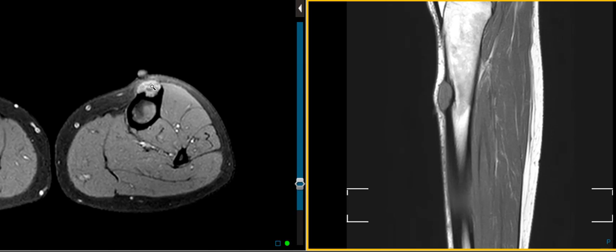And that chondroid matrix, the fact that it's coming off the anterior surface, probably periosteum, the fact that it's been there for supposedly 3 years by clinical history, and that it has very sharply defined margins, makes us think that it may be a periosteal chondroma, which we also call a juxtacortical chondroma. These bone lesions will have this chondroid matrix, well-defined margins, and again, they come off the anterior surface of the bone. And the problem is that a chondrosarcoma can produce an identical imaging appearance. You really have a hard time telling those apart just based on the imaging alone.